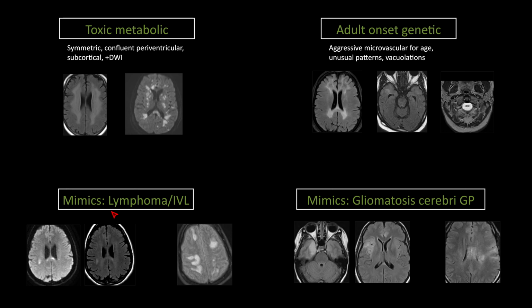Keep that in mind. Finally, we talked about the gliomatosis cerebri growth pattern. That's when you have a signal abnormality with expansion involving 3 or more lobes in the setting of a glial neoplasm. And for all intents and purposes, these can be extremely difficult to distinguish from just inflammatory or autoimmune white matter disorders.